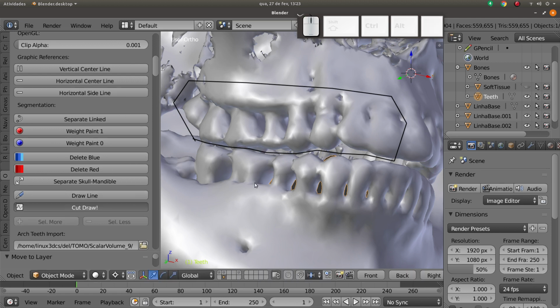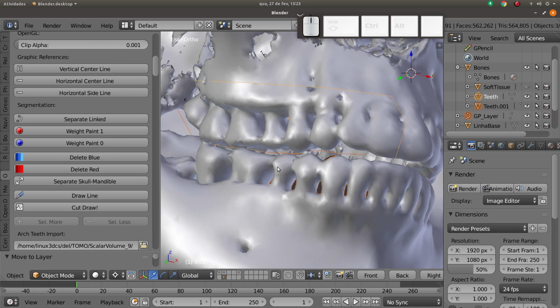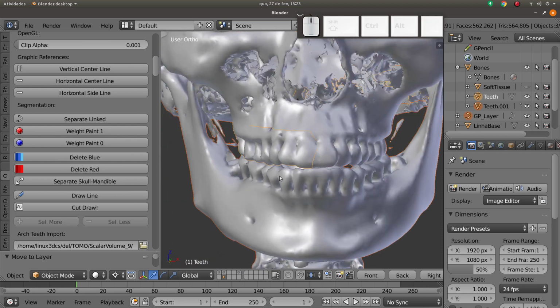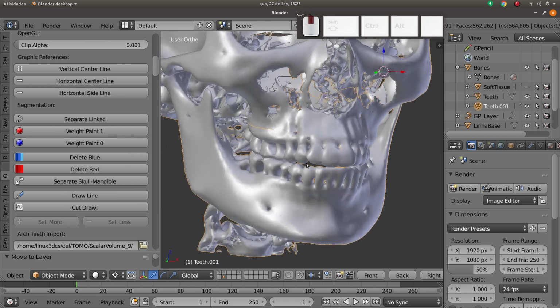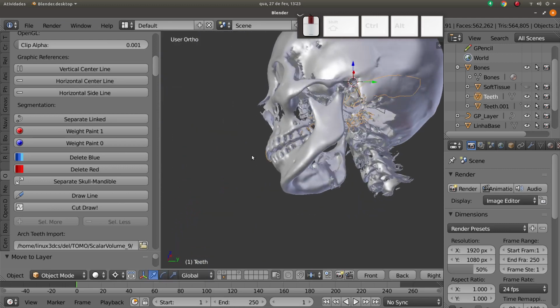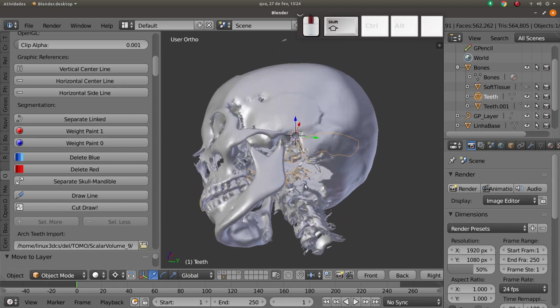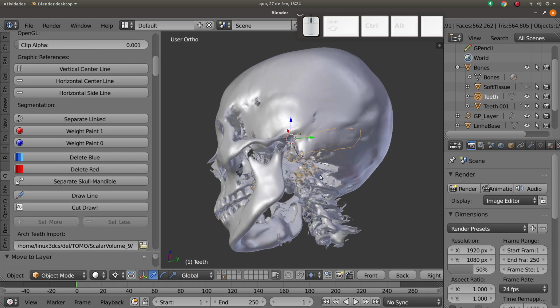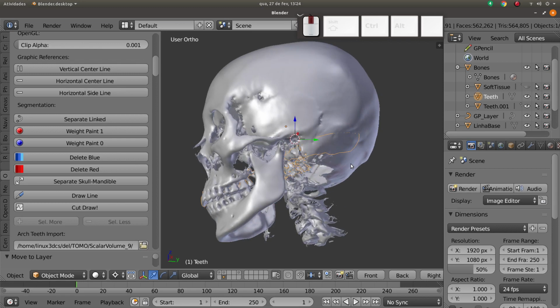You have to wait a little because it's a complex model, and it can take some seconds, or depending on the computer, it can take some minutes to finish the projections. Look, it's finished. So to show you, I will select it and I will move it. Look, the draw is through, the selection is through, and all this draw was selected until this part.